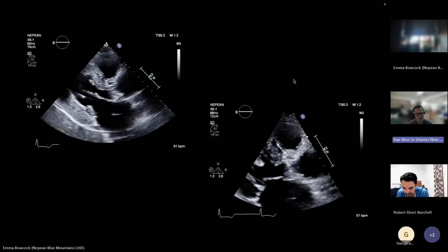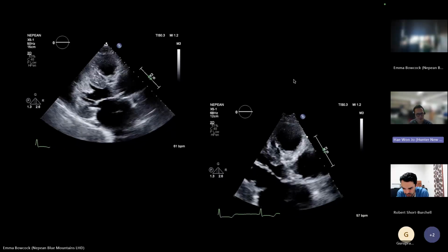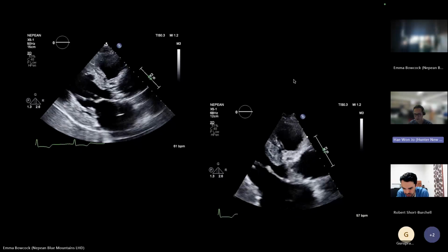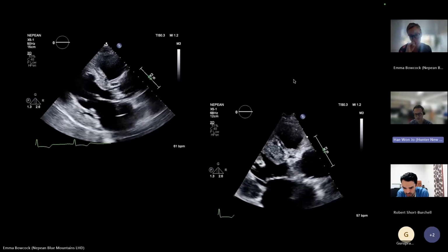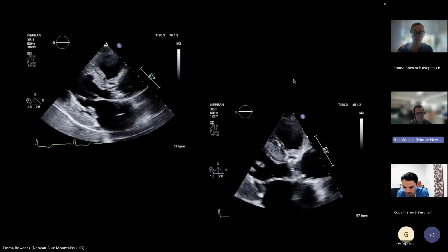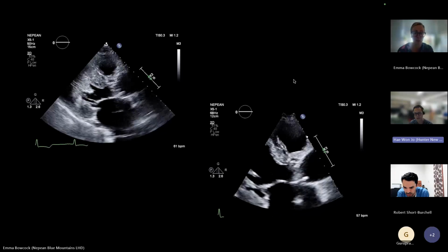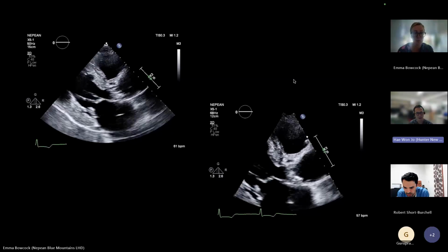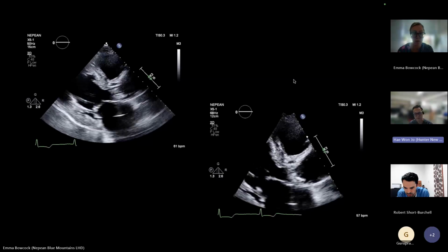I'm not quite sure what type. The opening of the aortic valve prosthesis also appears impaired on this view on 2D, but I like to look at some other views. Also, it's most likely to be a mirror image artifact in the LA. Otherwise, LV function appears normal.